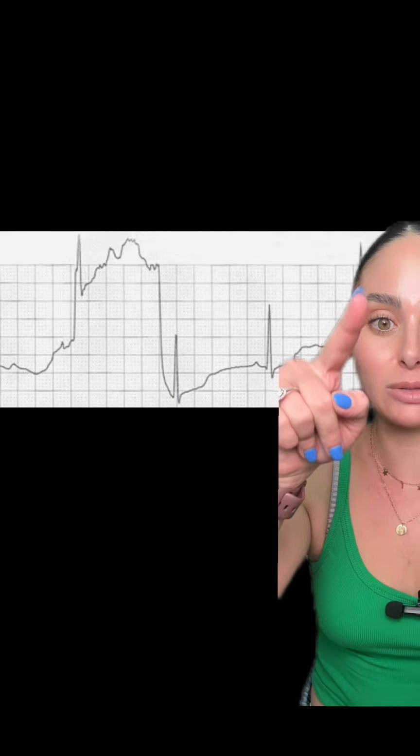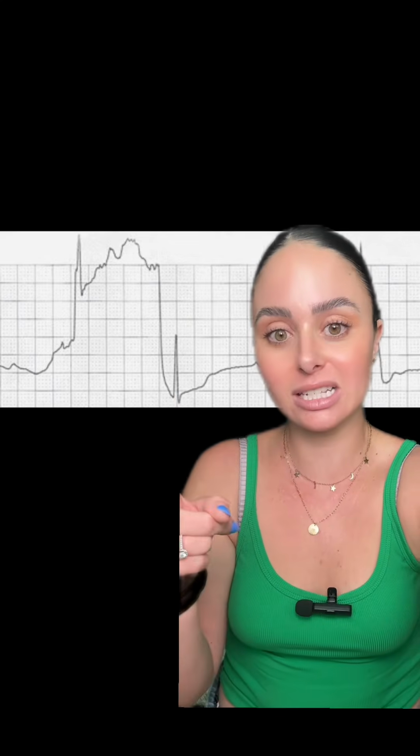This is also artifact. You can see that our ECG kind of goes up, back down, and then comes back up again. Most likely this is the patient's respiratory rate interfering with the ECG, and it's a motion artifact because this is probably the patient taking a breath in and out and in and out. Also artifact, this is just something random. You can see your ECG here and then just probably someone jiggling something around.